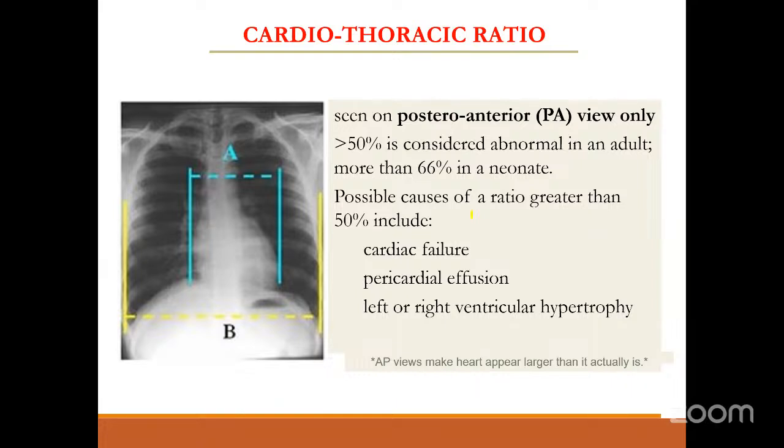This X-ray is looking at something called the cardiothoracic ratio, which is usually looked at in a PA view, but not in an AP view, which is routinely done in the ICU. So what we learn from a PA view X-ray, we can't blindly apply on an AP view X-ray. In a PA view, they look at the cardiothoracic ratio to see if the cardiac shadow is enlarged.